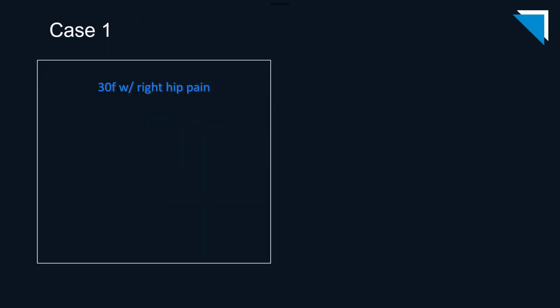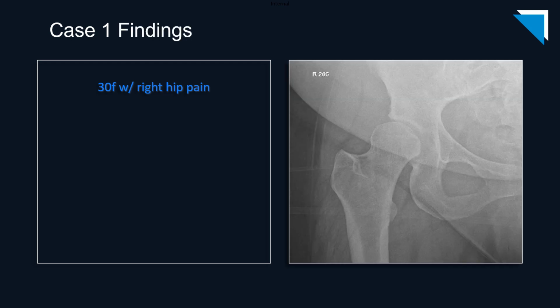Our first patient is a 30-year-old woman with right hip pain. We'll begin, as we so often do, with an AP radiograph of the right hip.